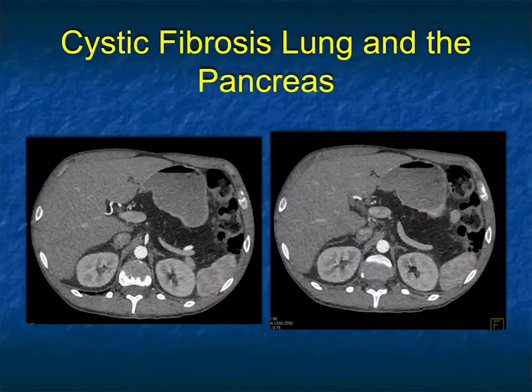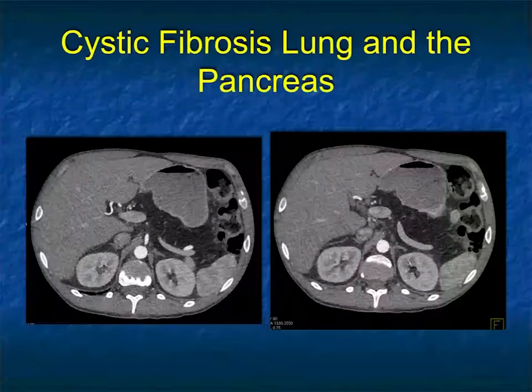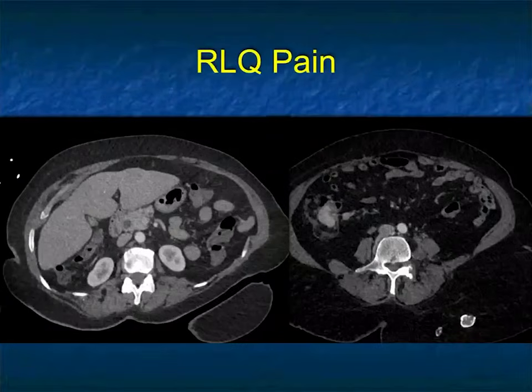And again, we did AI on this, and AI cannot find the pancreas. But that's perfect because I'm not really seeing the pancreas. I'm seeing the outline of the fatty replacement and where the gland should be. Really nice case. Right lower quadrant pain.